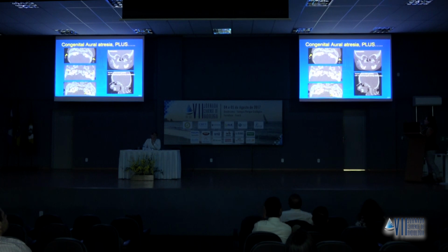Let's take a look at the temporal bone for these patients, and here you do see absence of the external auditory canal on each side. So there is bilateral EAC atresia. Moving inward, you do start seeing the ossicles that look deformed. And then looking at the inner ear structures, the vestibules look somewhat deformed as well. Plus the temporal bone abnormalities, you do see the cleft palate for this patient. And when you look at the sagittal profile, micro and retrognathia is clearly seen. The tongue has a somewhat vertical orientation, and the nasopharyngeal airway is significantly compromised.